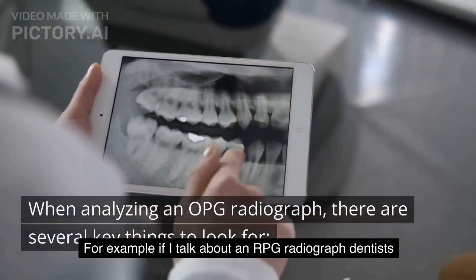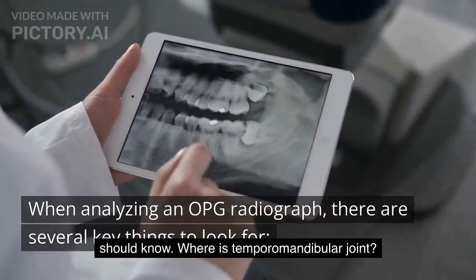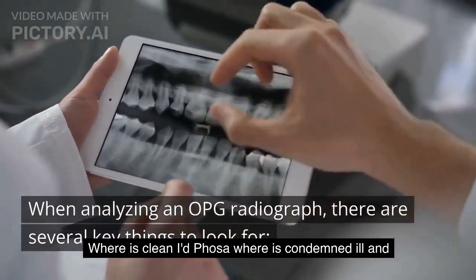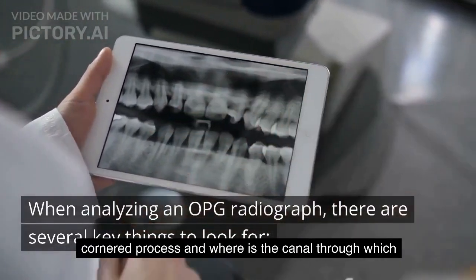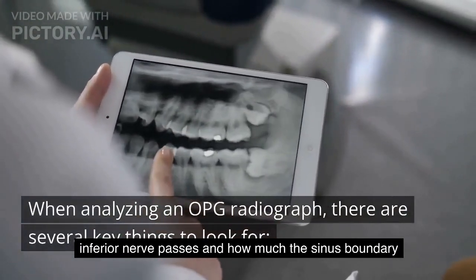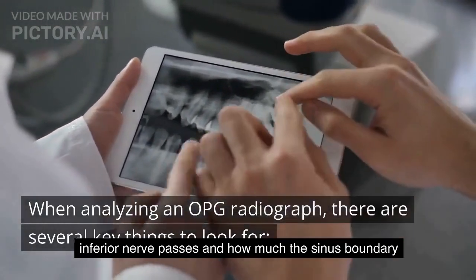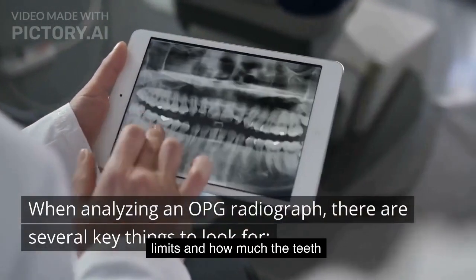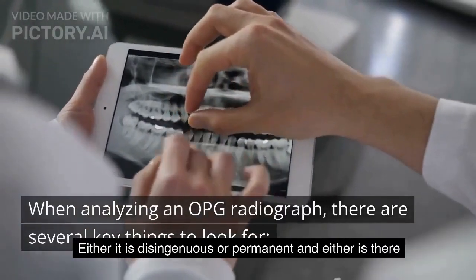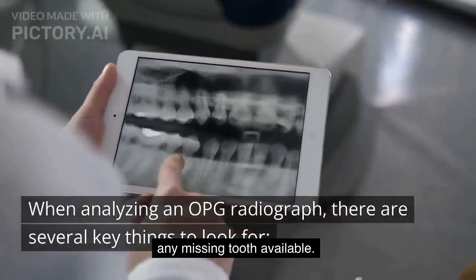For example, a dentist should know where the temporomandibular joint is, where the glenoid fossa is, where the condyle and coronoid process are, and where the inferior alveolar canal is, through which the inferior alveolar nerve passes, and what the sinus boundary limits are, and how many teeth are present in the oral cavity, whether deciduous or permanent, and whether there is any missing tooth.